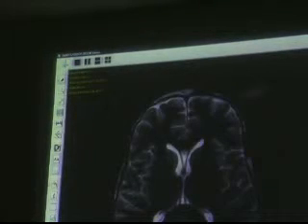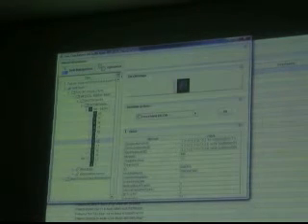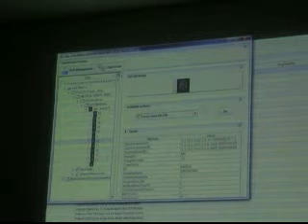So as we said, for the moment, you can only browse the data. You cannot modify the data because that was not the original intent of that application. We are working on this possibility, but it's not for this time. So this is basic browsing of patient data.